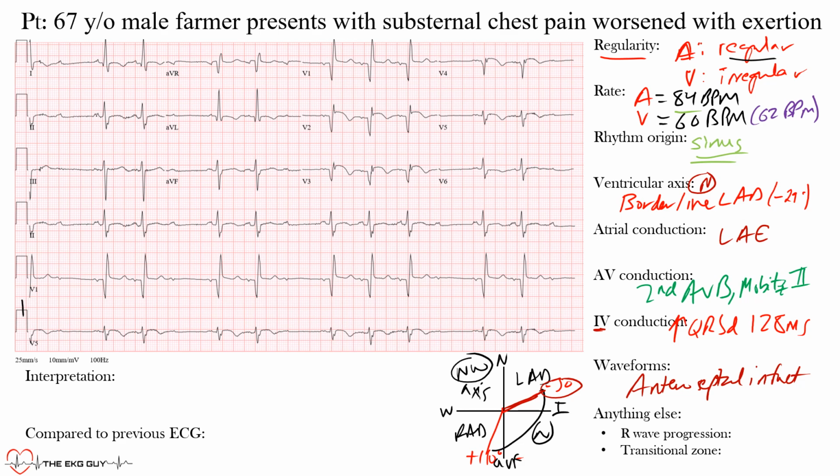Whereas in left bundle branch blocks, we start thinking of using Sgarbossa criteria or some other ways to identify it, because the left ventricle makes up most of the QRS complex. So what do I mean by a right bundle branch block pattern? Well, what you have going on here is a QR prime pattern. Meaning that the initial R wave that you tend to see with an RSR prime pattern in a right bundle branch block is not present. Instead, that initial R wave is now pretty much dead and inverted because of this infarct pattern.